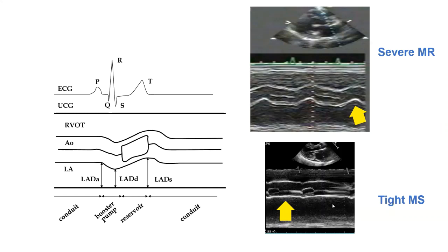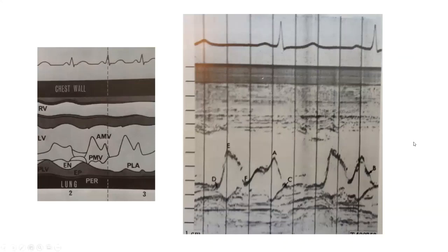In mitral stenosis, conversely, in diastole, the left atrium is not decompressing the way it does normally. Here's the decompression of the left atrium as the left ventricle is starting to fill after aortic valve closure. Look how this line of the posterior wall of the aorta or the anterior wall of the left atrium is really not moving that much, and that's because of the slow filling occasioned by the mitral stenosis. So you can get these kind of indirect clues.